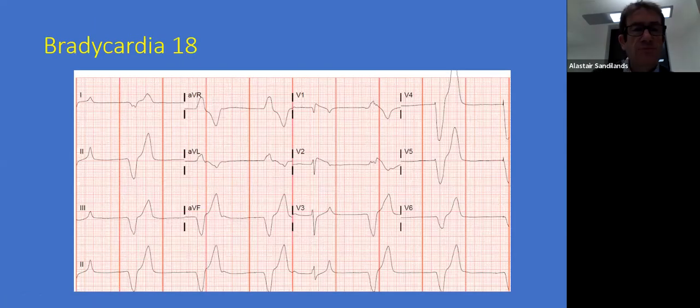So this is really a spot diagnosis, really. It's a very bizarre looking, irregular ECG. It's a broad QRS, very bizarre looking. Doesn't really fit the bundle branch block pattern at all. And the T waves are very tented here. Irregular rhythm, so different beat there, no P waves, tented T waves, and this is your example of hyperkalemia. So it doesn't fit any bundle branch block pattern. Tented T waves, no P waves. This is hyperkalemia.